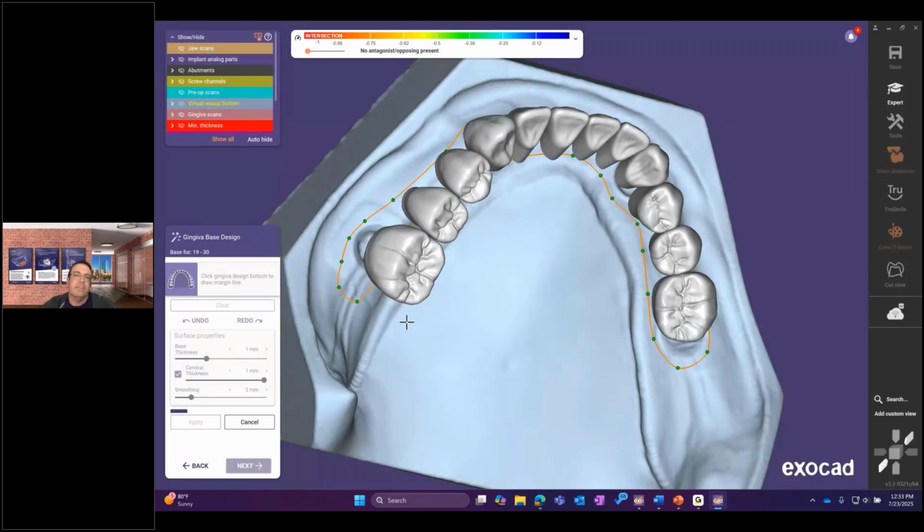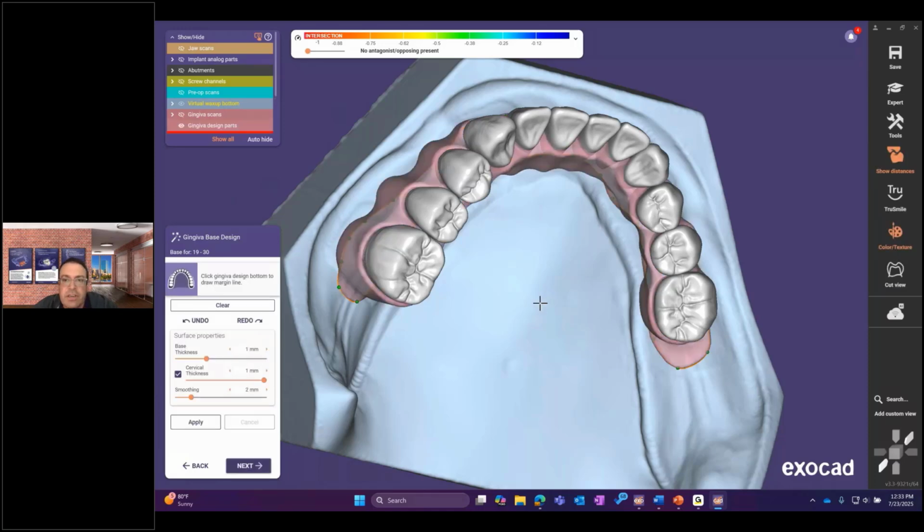Draw that outline appropriately. Of course, with the freeforming tools afterwards, we can really contour that gingiva, and we can make it rounded and really minimize the contact surface if we're looking for a super hygienic design. But that'll be a good starting point here.